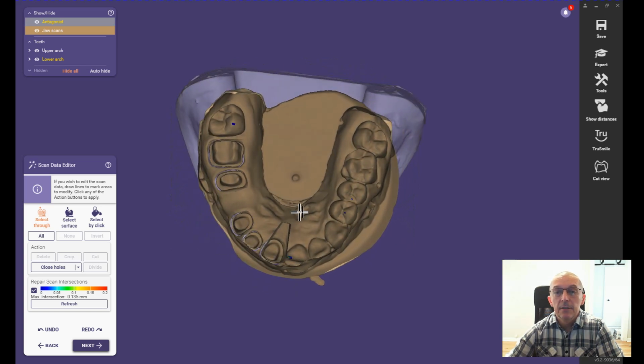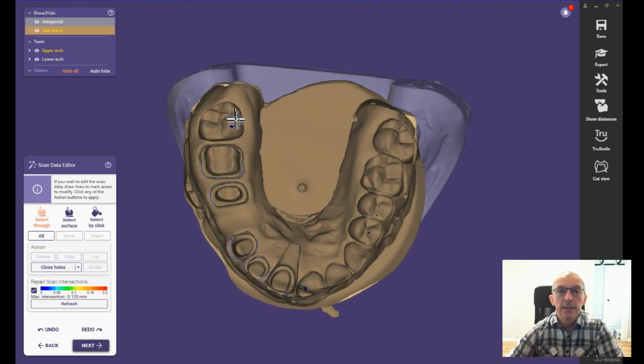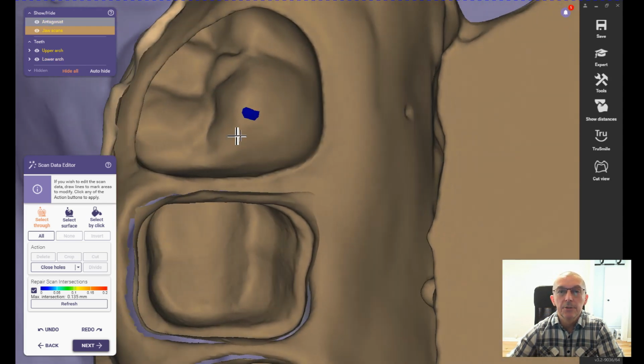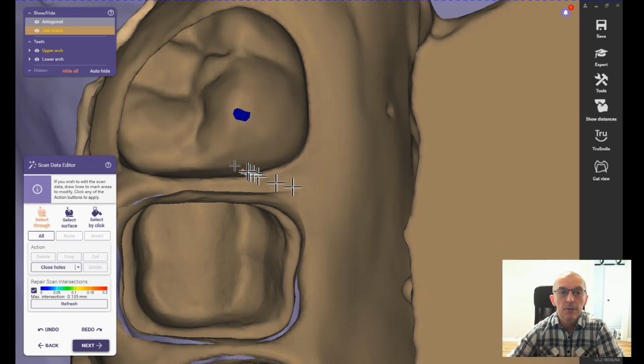Like here you have little areas during the contacts. This is where it's touching, so it might be going in a little bit too much into the opposing model. So if we hit to cut the intersections, then it will automatically make this like a perfect model.